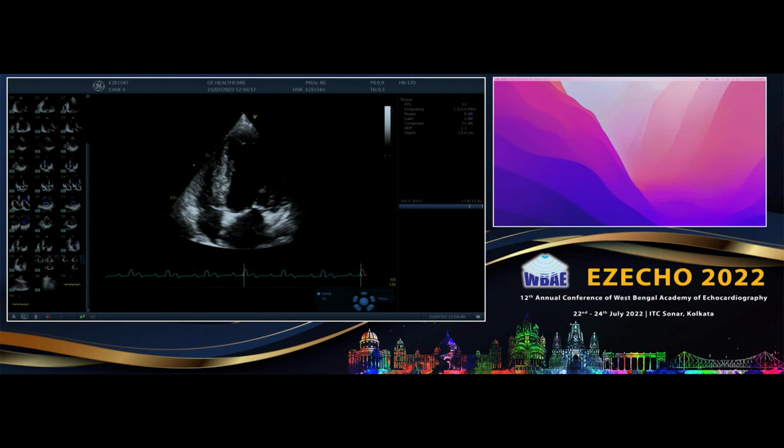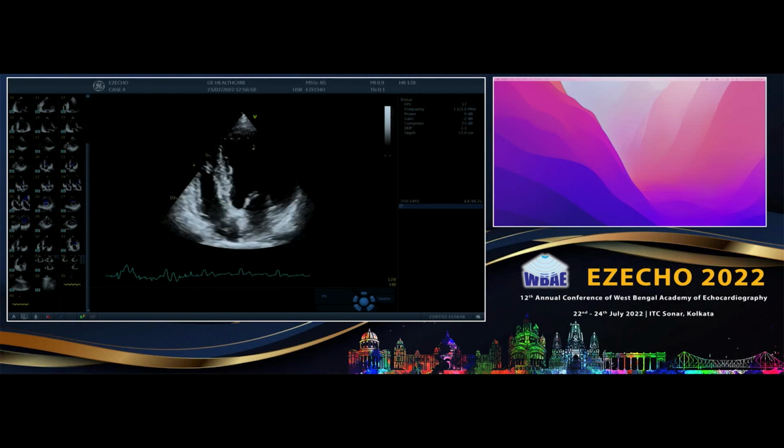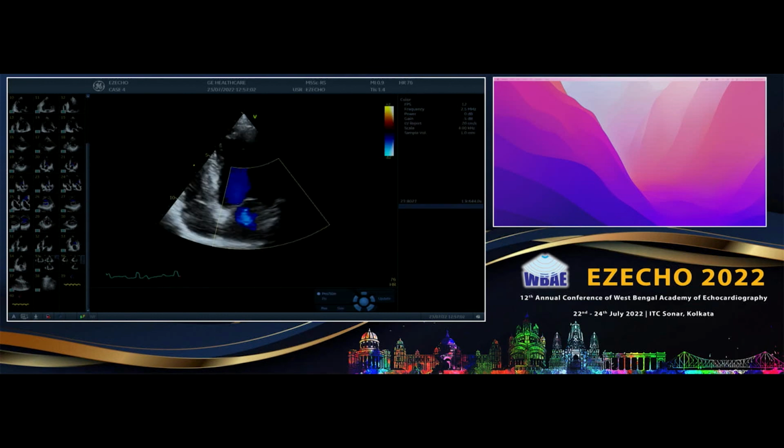If you have a very nice E wave variability with RR variability, generally the filling pressures are lower. Second thing is you go by the E deceleration time, because that doesn't change. However, maybe the RR interval changes, E deceleration time generally doesn't change. Rest everything changes with this, and then the E by E prime, the problem is that if there's too much variability, then what to take.